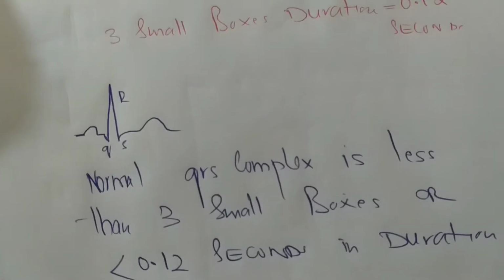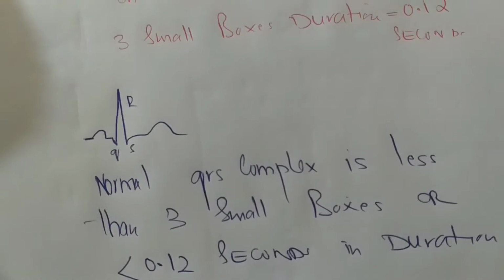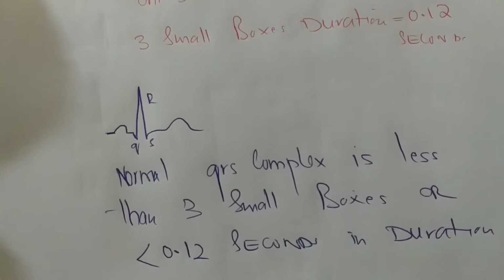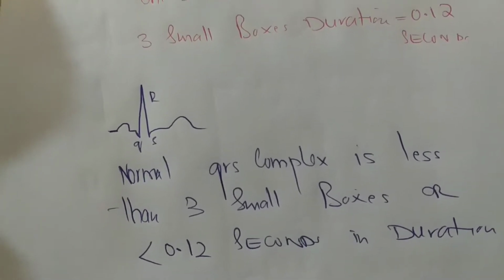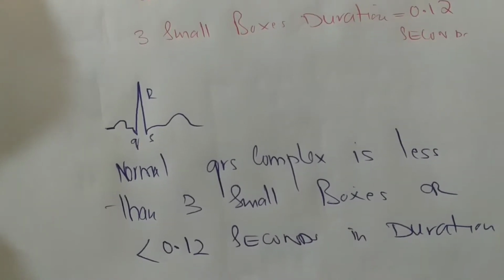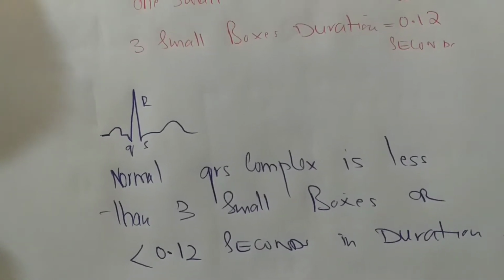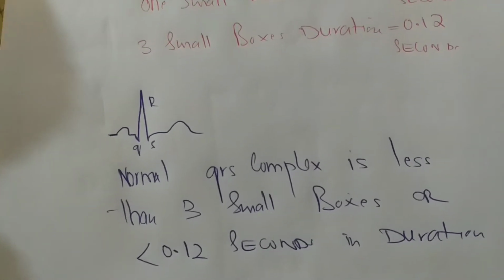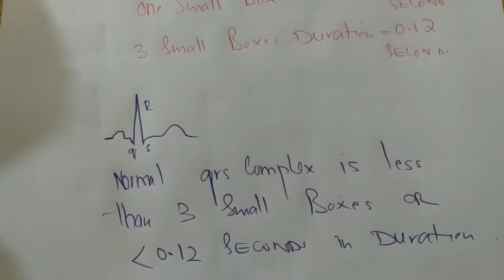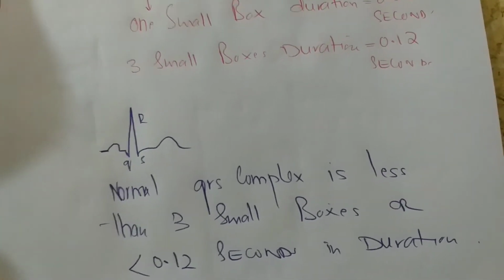And why is the QRS complex narrow? Because the impulse rapidly moves from the bundle branches to the ventricular muscle and causes its fast depolarization. Both ventricles depolarize simultaneously, and it generates a very narrow QRS complex in which there is depolarization of both the right and the left ventricular muscles, but because the phenomenon is happening so simultaneously, there are not two displays of the ventricular muscles. There is a single display in the form of a very narrow QRS complex normally.